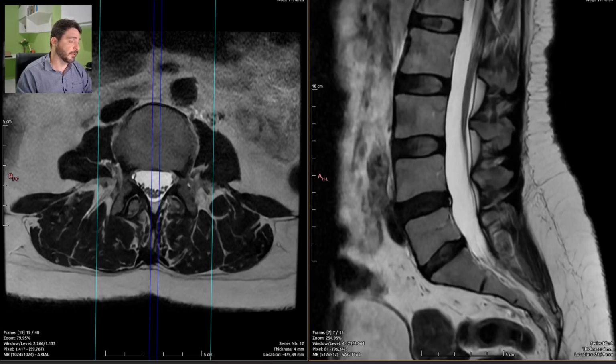I'll summarize the report, which makes it much easier to read, so the referring physician is happy with our report much more than if we had not summarized it. So it's good practice. I endorse it and I recommend it. It just takes a couple more minutes to summarize the report and it goes a long way. So it is done, sign it off.